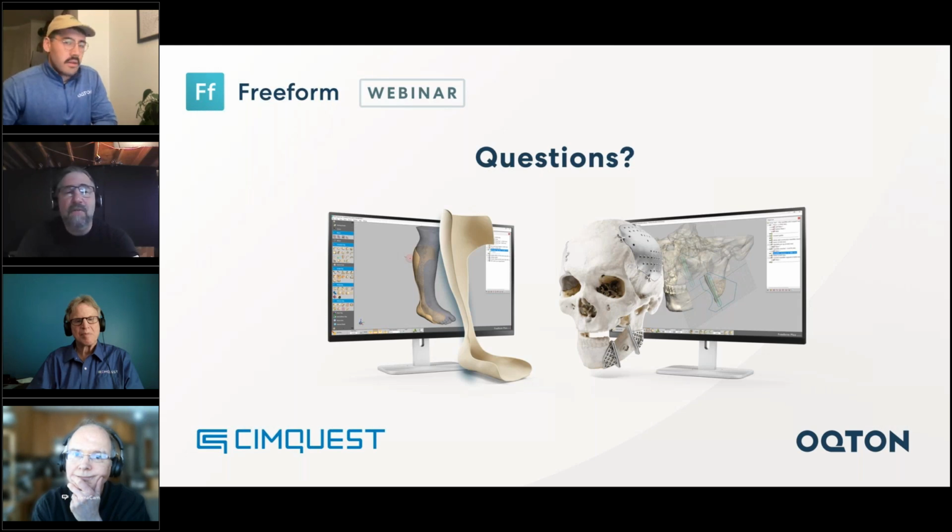We can, to some degree, overlay the 2D slices. When you generate the model, it can capture the color information from the slices, so you will see that. Inside the viewer itself, you can see an outline preview of your mesh or your clay in regards to the image stack.